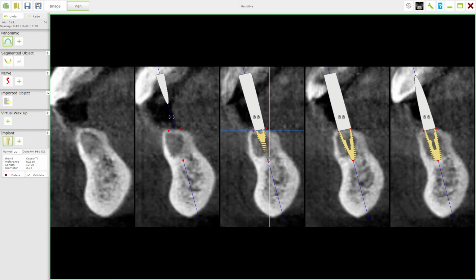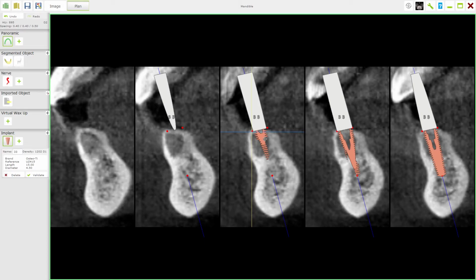And if I click on that now, if I left click on there and I just pull it down, I'm stretching it. And I'm going to stretch it, that's a 12, and I'm going to stretch it to a 15 if I can. That's now a 15. So I just moved my cursor, changed it to an eye, and then I left clicked on the mouse and held the click down so that I could stretch the implant. And if we look at the implant data box here, we can see that we're still at 3.75 but at 15 millimeters. And in the same way, if I wanted to jump a diameter, I can position my cursor over here and I could change the diameter and make the implant wider, and it's turned from yellow to this nice pink size, and we've gone to 4.5 at 15.